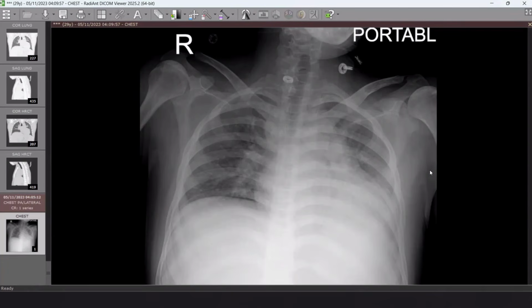I think the bones show slight diffuse increased density. Do you agree? What is this configuration of the spine? Maybe there's increased density in the upper and lower vertebral endplates.